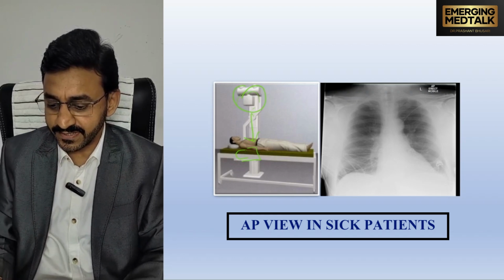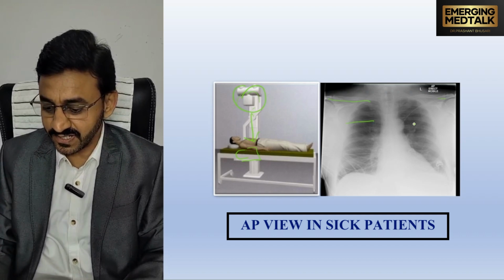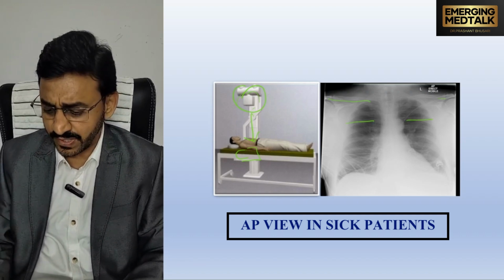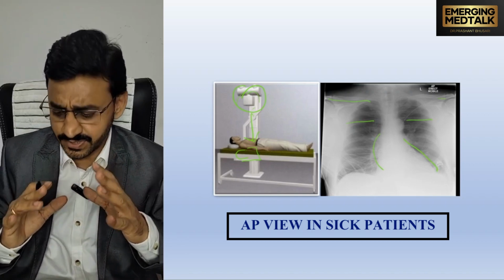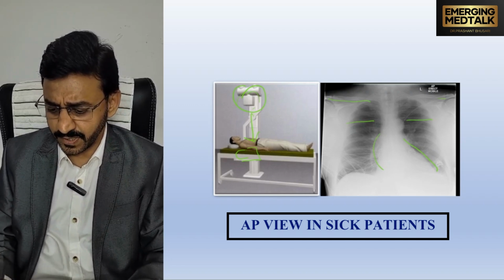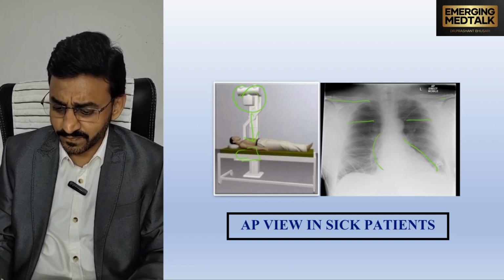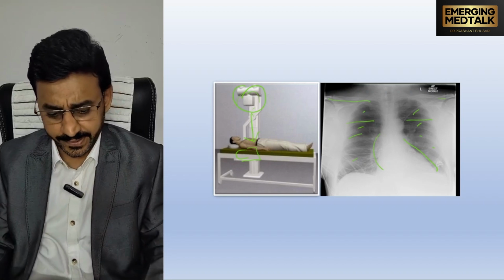So here we can see transversely straight clavicles, then transversely horizontal running ribs also. Then there is a magnified appearance of the mediastinum, that is the heart, and also we can see bronchovascular markings equally distributed on the whole of the lung parenchyma.